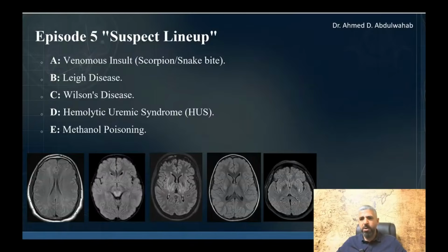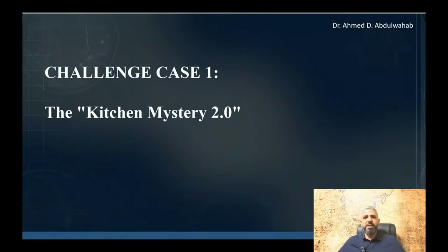You must use all your deductive skills to crack case number 1. Are you ready for case number 1? I call it the kitchen mystery 2.0. If you remember, we had the kitchen mystery in the previous episodes. So this is the kitchen mystery 2.0.